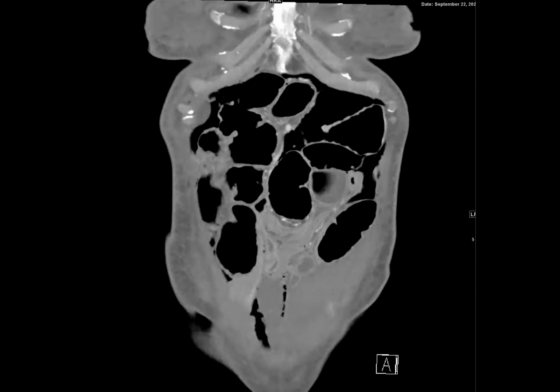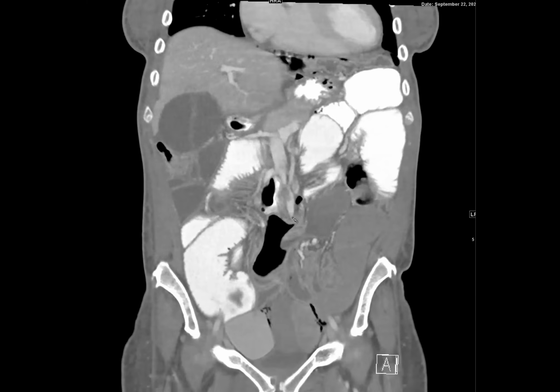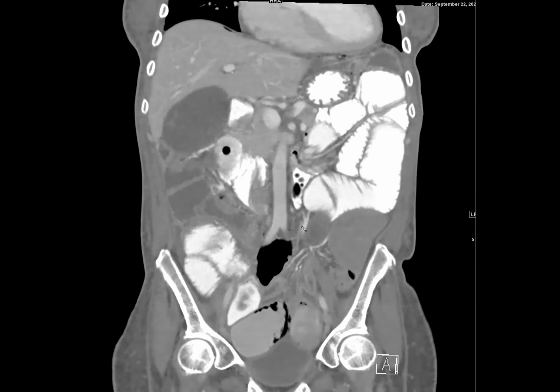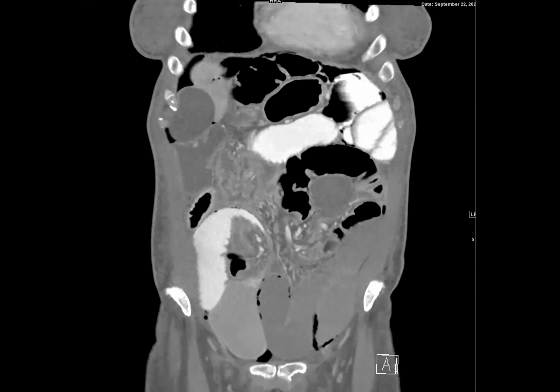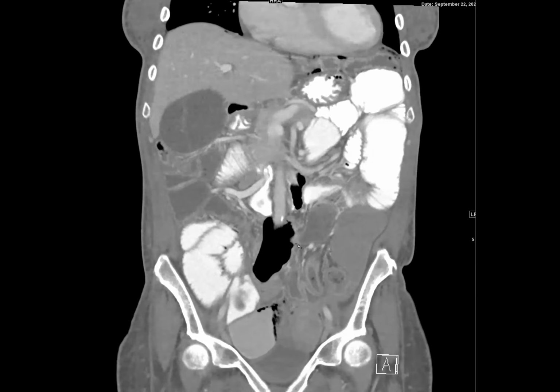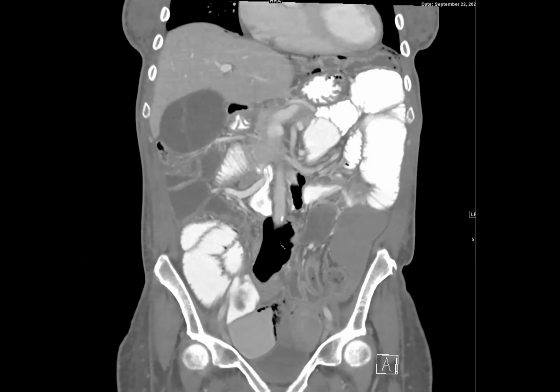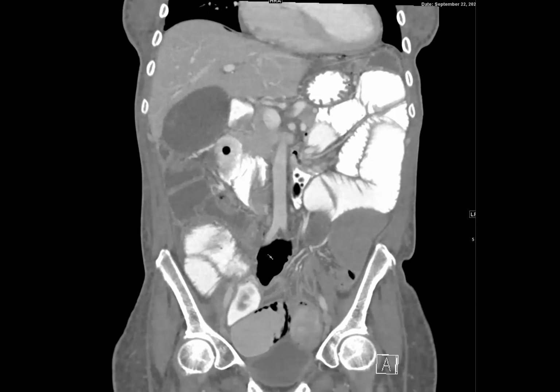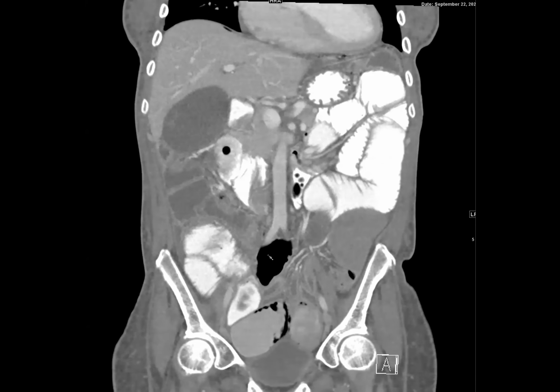There's also pneumoperitoneum. Is this a normal finding? Is it a common finding? Is it abnormal? I'm not as concerned as I used to be about most pneumatosis. I probably would be looking up to see if this happens in scleroderma. Exactly, so that's exactly what we did. It's probably on the list of things that so-called benign pneumatosis is associated with.